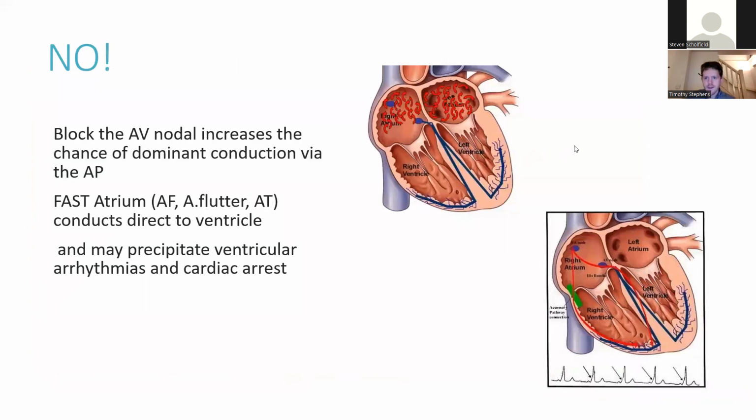Okay. I can see, just finishing off now, guys. I promise, last 2 minutes. So you're turning orthodromic into antidromic. Effectively, you've got these two pathways here, but you've taken one of them away. And yes, you're basically not creating this. Yes, you are. Yes, absolutely right. Actually, I'm just thinking myself through there. You're effectively making this pathway dominant, but you're taking the fibrillatory waves straight away through here. So you're right there, Bob.